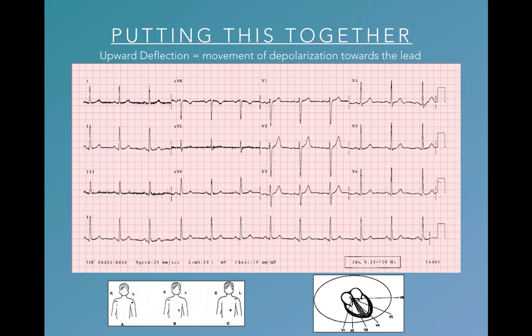Okay, so here's a 12-lead EKG, and if you need some help remembering, you can go back and look at how I broke down a 12-lead EKG for what the leads mean. The one thing that I haven't shown on prior slides is the rhythm strip, which is the bottom line on the EKG and is continuous. It's not separated by the other leads like the other three lines are. And I'm not sure if that's a 1 or a 2, but usually it's the second lead that is the rhythm strip.